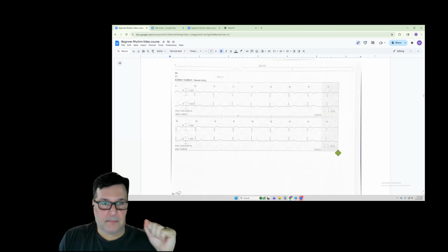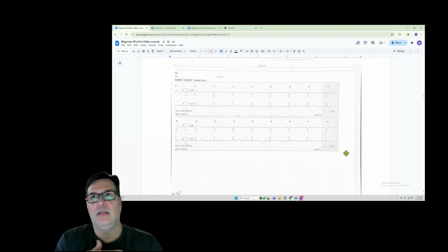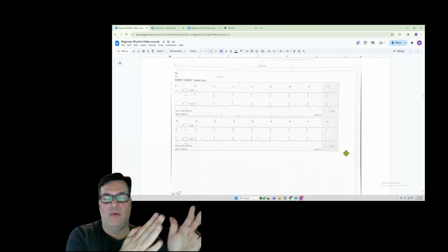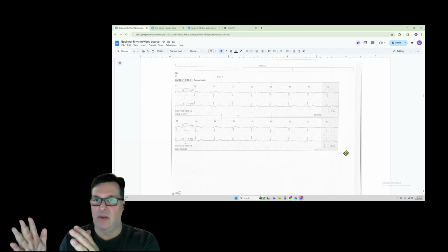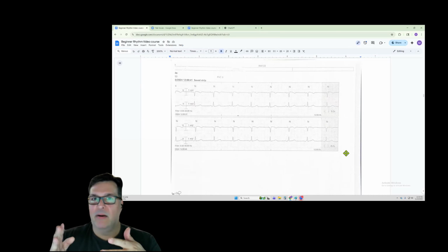Excuse me. Is it patterned irregularities with the P waves with the atrial ectopic rhythm, or could it not be a pattern? Not necessarily. You'll see a pattern to the irregularity more because the heart rate will change, where it'll be a little faster over here with one P wave, and a little slower over here with another P wave. So there'll be that irregularity with a pattern, in a sense.